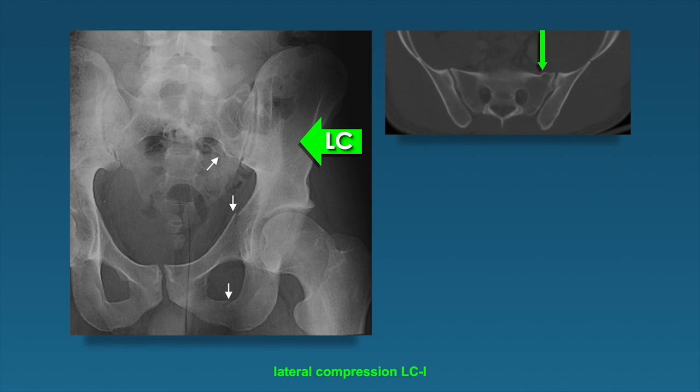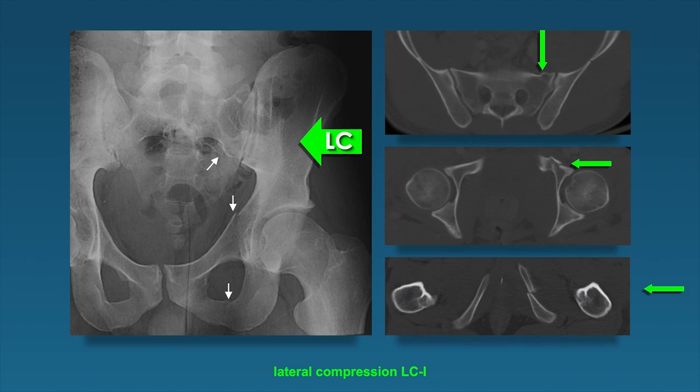Here's our lateral compression fractures involving the superior and inferior pubic rami, often in this coronal plane that goes along with the direction of the force in the majority of cases.